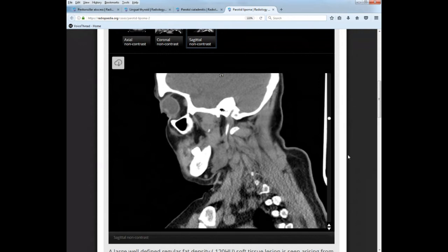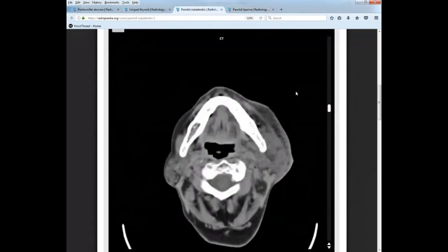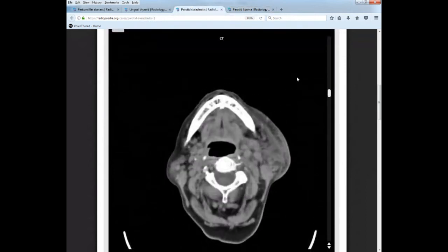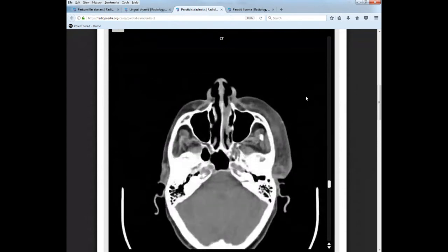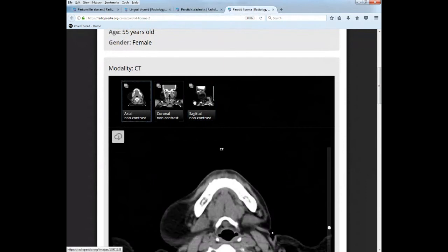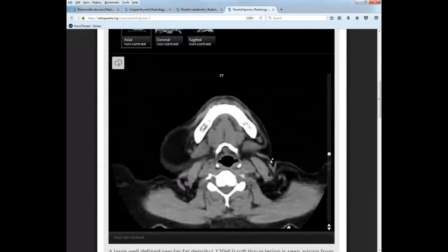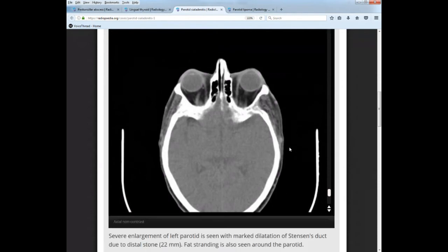Let's look at, to go over some glands. We have to go over the parotid glands. So easiest to see in an axial, I probably would only ask you in an axial, and on this patient that has the parotid sialadenitis and the parotid lipoma, and axials are going to be the easiest ones for you to see. So switch over to this one. Let's look at the axial image.